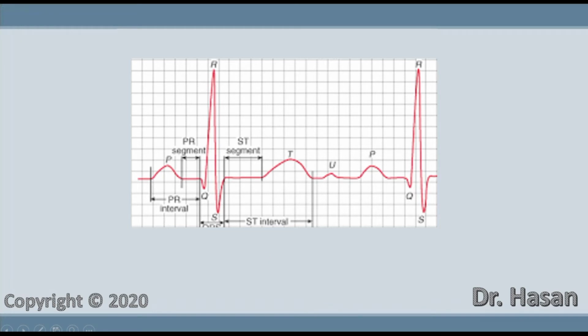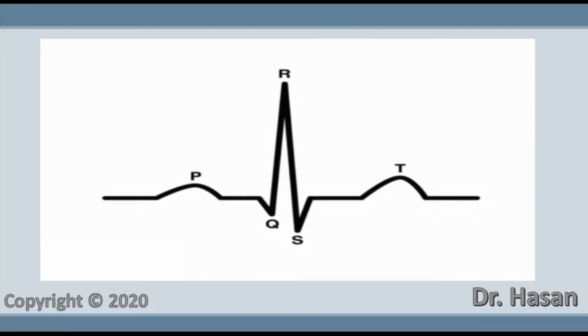Why did I say the main ones? Because there is still a 6th wave. It's the U wave. But we will not consider it, since its diagnostic value tends to 0. In addition, there is still much debate about the origin of the U wave. Secondly, why are the waves called P, Q, R, S, and T? The answer to this question is known only to the fathers of the ECG, who invented this method. Therefore, these letters do not carry any meaning and logic at all. These waves are called so because they were once called that.